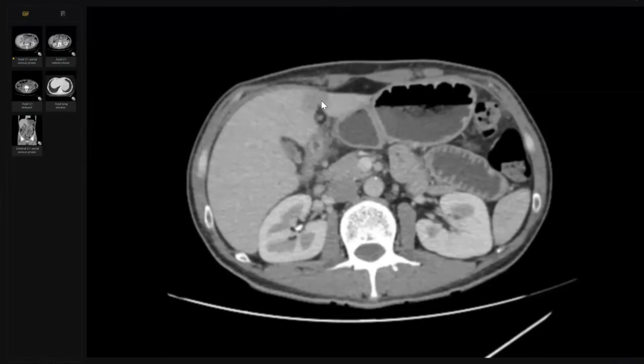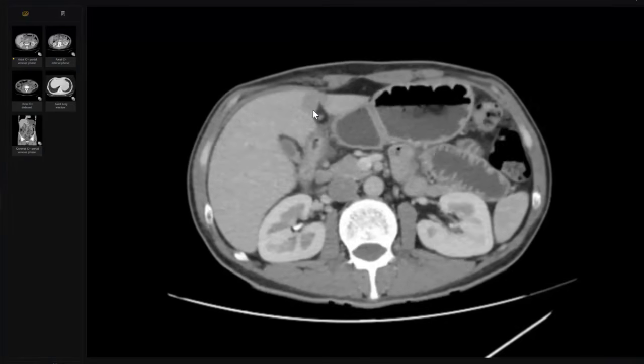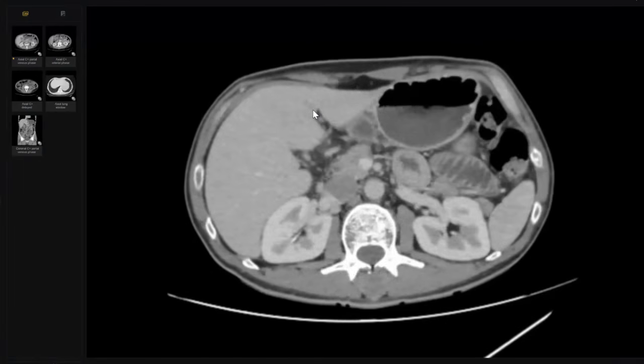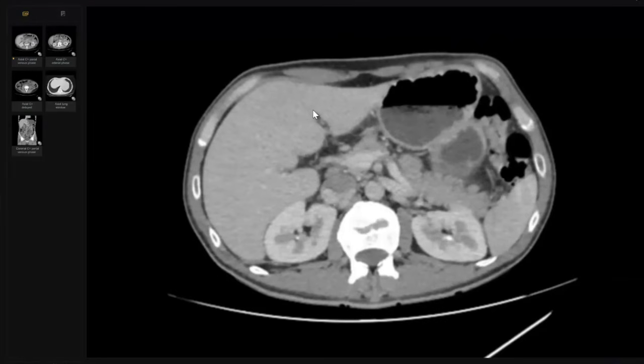There is some venous drainage here which is different from the rest of the liver, so it is seen very obviously only in the venous phase. Why? Because it drains to, I think, a vein called the vein of Sappey or something like this. Anyway, this is a pseudo lesion, very common in this location, around the fissure in segment 4. You will not see it in arterial, you will not see it in delayed. Anyway, thank you so much.